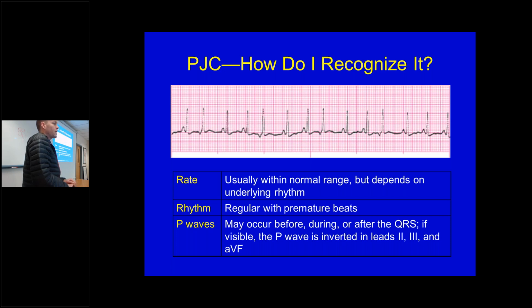If you think it's irregular, then you're looking at your P waves, right? And you can see that P wave morphology. From the very first complex, you've got that morphology, and then there's a quick beat that doesn't look like it has a P wave. Then you got that same morphology again.